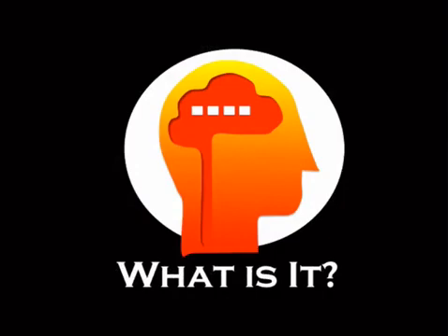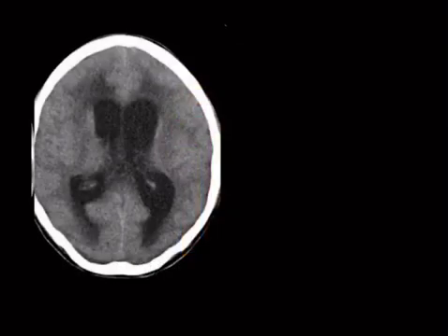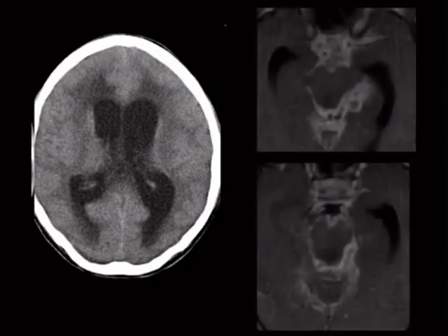All right, so next case. And we've got hydro here. I'm showing you hydro. That could be anything, right? And then the next case is this. So this is the skull base, or lower down, not quite the skull base, but the basilar. And it's a T1 post-contrast. I'm showing you lots of enhancement, so too much enhancement. So this is our basilar meningitis.